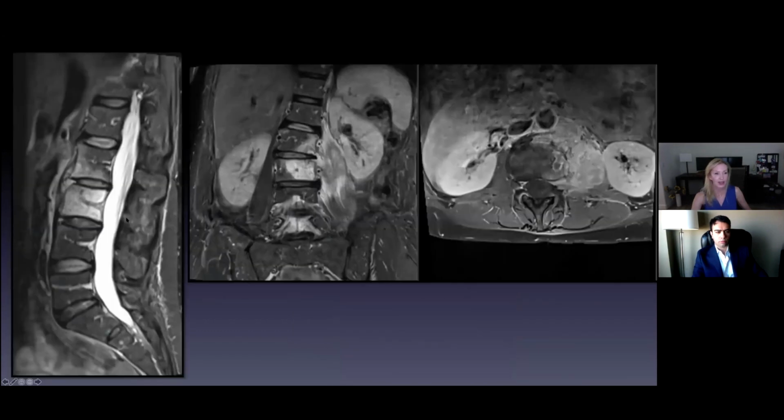This is just a really pretty picture that I put in because it's just so beautiful. This is a coronal. So you're looking at a person like if you're standing in front of them and it's sliced straight down. So kidney, spleen, liver, spine in the middle, pelvis, sacrum right here. So this enhancement right here is osteomyelitis in the vertebral body. This infection coming out the side into the psoas muscle right here. This is all edema. This is a post-contrast image, so it's edema and inflammation. This part that's not enhancing is abscess. Pretty picture. So I had to show it.